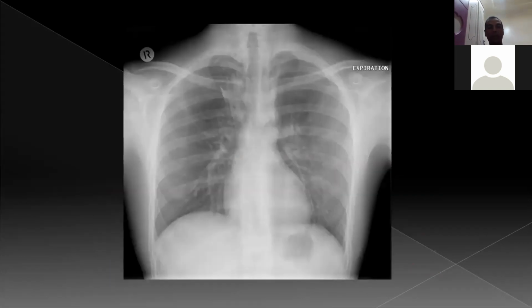Yeah, we will jump to pneumomediastinum. In this chest X-ray, you can see streaky lucency in the mediastinum. You can see this one. You should be familiar with this one, one of the most important emergencies. This is a pneumomediastinum, streaky lucencies inside the mediastinum.